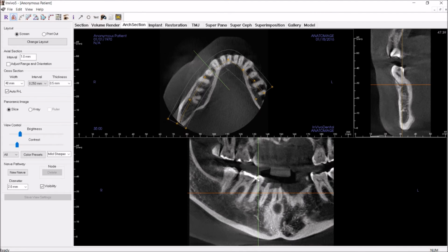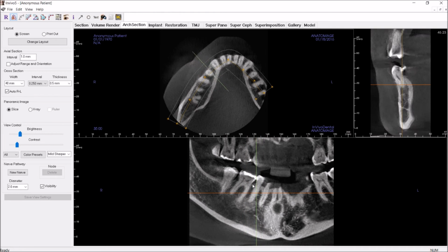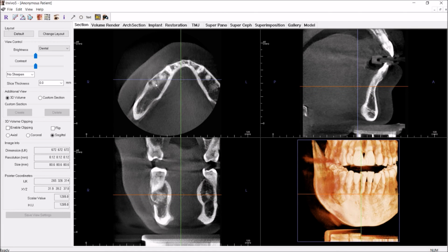If you want to look at expansion, you can look in this cross-section view. Maybe the slightest bit of expansion. There's thinning of the buccal cortex. There we see a little expansion. In the axial view, I like looking at that for expansion. Again, the distal one, maybe some possible expansion, but definitely some thinning of that cortical plate. All right, ready for your differential?